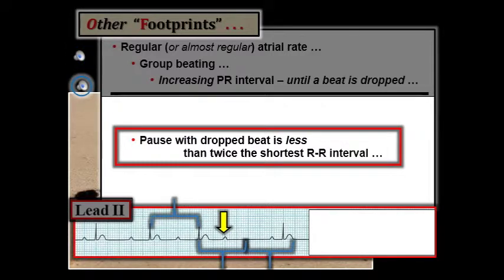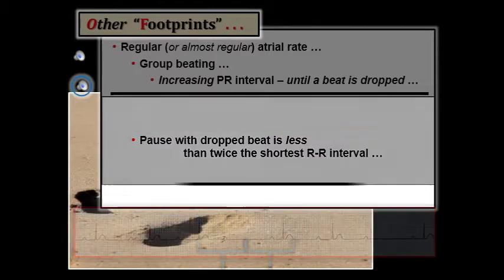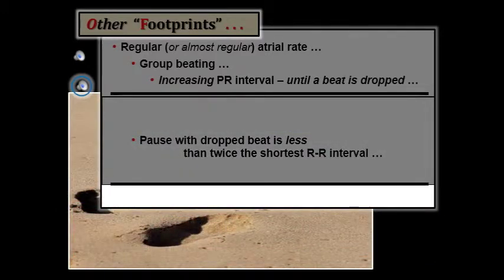The reason we specified AV Wenckebach as the equivalent of Mobitz 1 rather than just Wenckebach is that there are many other rhythms that may on occasion manifest Wenckebach conduction. These include atrial fibrillation or flutter when there is group beating, SA block, junctional escape rhythms, and even VTAC with retrograde Wenckebach conduction to the atria, to name just a few.